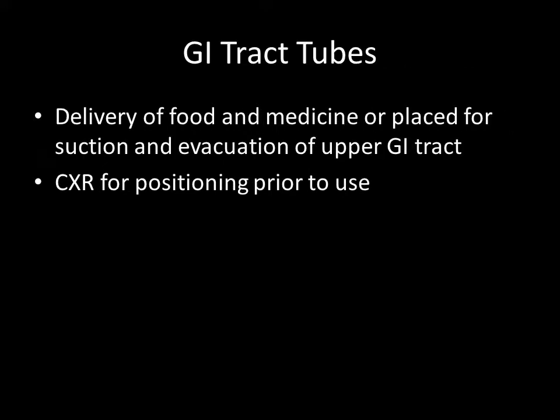For the GI tract tubes, pretty simple. There's a tube to put food through or to suck GI contents out. And again, it's basically just recognizing that you're looking at a GI tube and that you know where it's supposed to be going and what it's supposed to be doing.